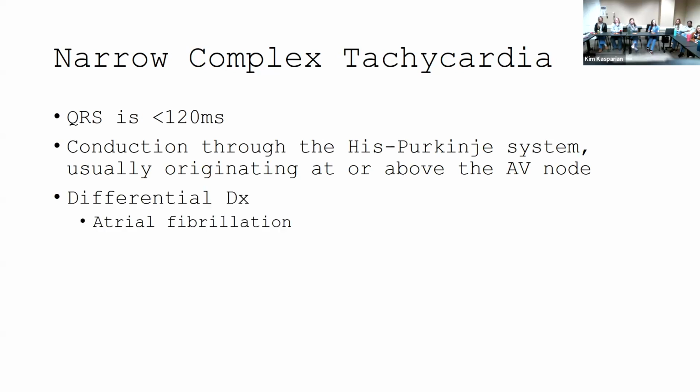So differential, I accidentally gave you AFib. What else might be a narrow complex tachycardia?